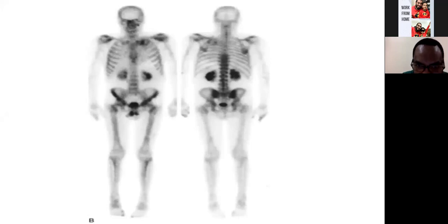Yeah, because remember that osteolytic lesions sometimes, depending on their nature, can displace the bony architecture of the region. So they can also appear as a reduced glucose uptake. But there are certain osteolytic lesions which will show intense glucose uptake, which is more than what you see on the bone scan. All right? All right. Yes.